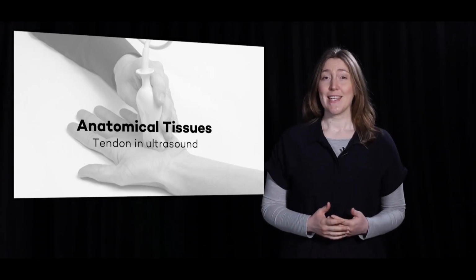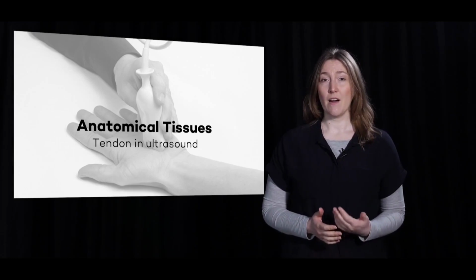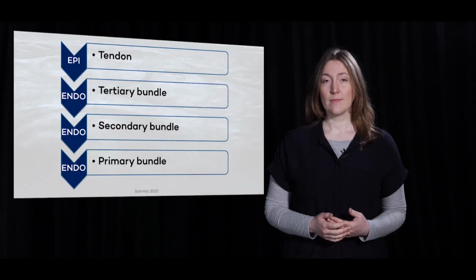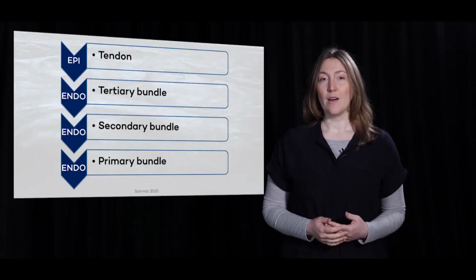The goal of this presentation is understanding how to recognise tendons and their specific architecture and characteristics when scanning them with ultrasound. Like a muscle, the tendon has different parts.